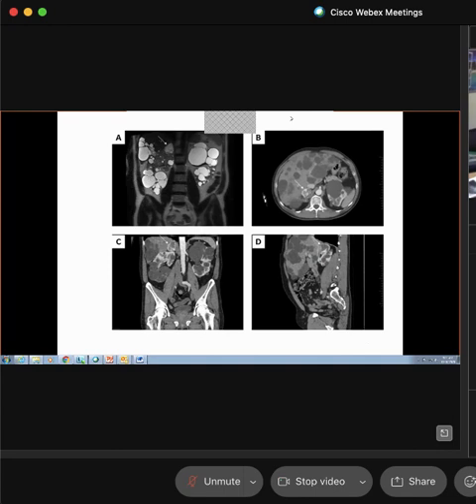Great. So I'm seeing coronal images. And what is this a coronal image of? Go ahead and type it in. Lungs. Good. It is of the abdomen. What gave it away? Anyone, you can say it out loud. The vertebrae? Okay, I like that. And you're also going to be able to see the vertebrae a little bit more clearly in the lumbar because of that.